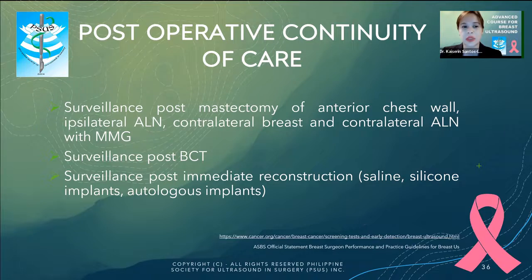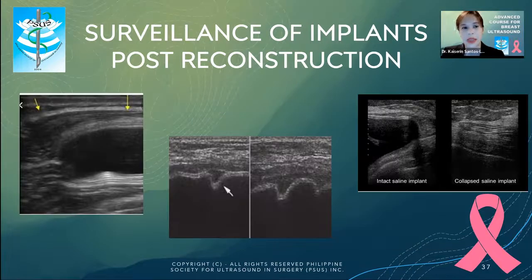Surveillance post-immediate reconstruction also to check our saline or silicone implants or even the autologous implants should the need arise. And also surveillance of implants post-reconstruction. It is important that we also view several images so that we know when there are abnormalities in these reconstructed breasts.